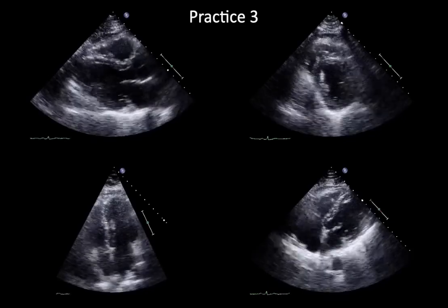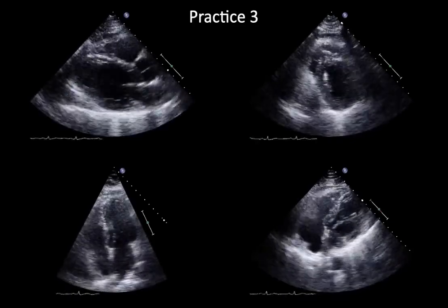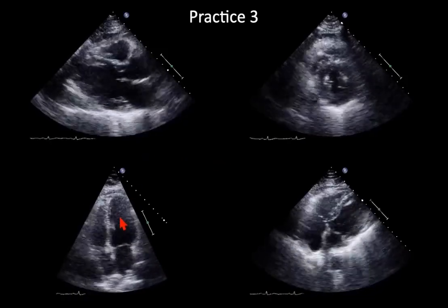In case number 3 here, we can see very good muscle thickening and shortening in all windows. Perhaps too good, such that the axial contraction is squeezing the left ventricle diameter to almost kissing.